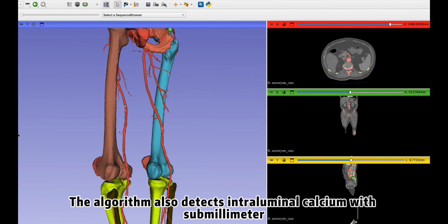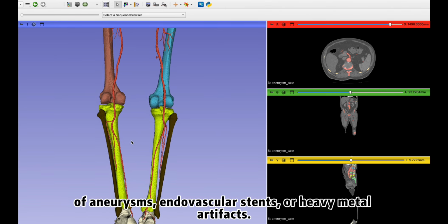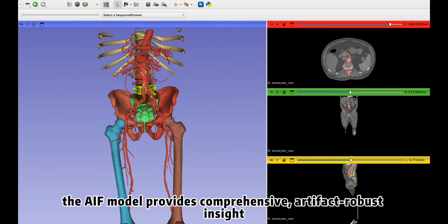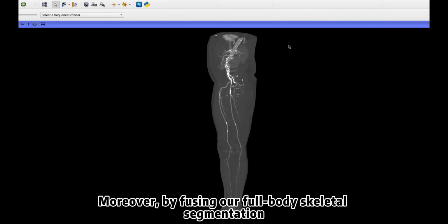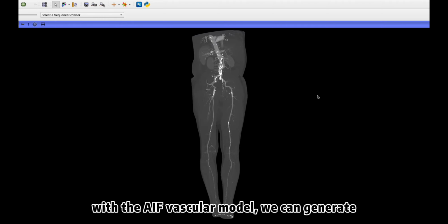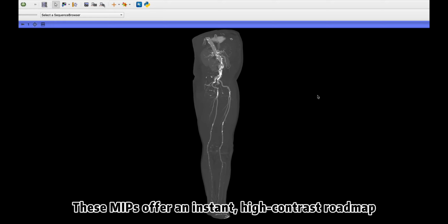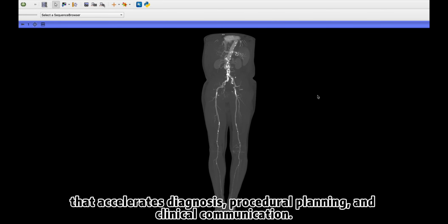The algorithm also detects intraluminal calcium with submillimeter precision and stays accurate even in the presence of aneurysms, endovascular stents, or heavy metal artifacts. By reasoning over both vascular and osseous cues, the AIF model provides comprehensive, artifact-robust insight for truly personalized treatment planning. Moreover, by fusing our full-body skeletal segmentation with the AIF vascular model, we can generate anatomically registered maximum intensity projection views from the raw CTA in a single click. These MIPs offer an instant, high-contrast roadmap that accelerates diagnosis, procedural planning, and clinical communication.